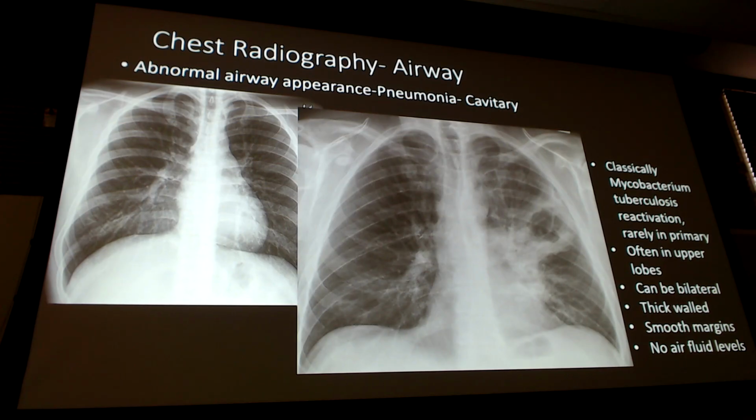Cavitary tuberculosis. That's got nothing more to say about that. Cavitary tuberculosis. The difference, though, that you can tell on this is what I like is you have your thickened walls around, and you have the cavity in the center. So I want you to take a good look at this and kind of get an idea and realize how thick the walls are. So what happens is we get the tuberculosis, the body and the immune system wants to try to fight it off. They wall it off to try to protect the rest of the body from the TB, and we end up with this cavitary pneumonia here.